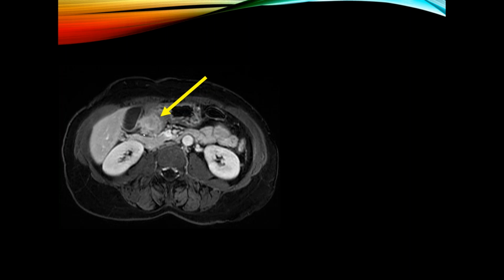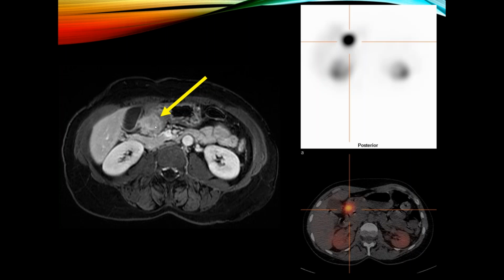And this brings us back to that MRI where there's that stomach, that gastric mass. This was actually missed on the MRI, and they couldn't find where the primary tumor was. And we did an Octreotide study, and it clearly lights up easily in the stomach. So then looking back, they looked back at the MRI images and realized that, yeah, that was actually the tumor. It just had been missed. So again, that's sometimes how helpful the Octreotide study is.